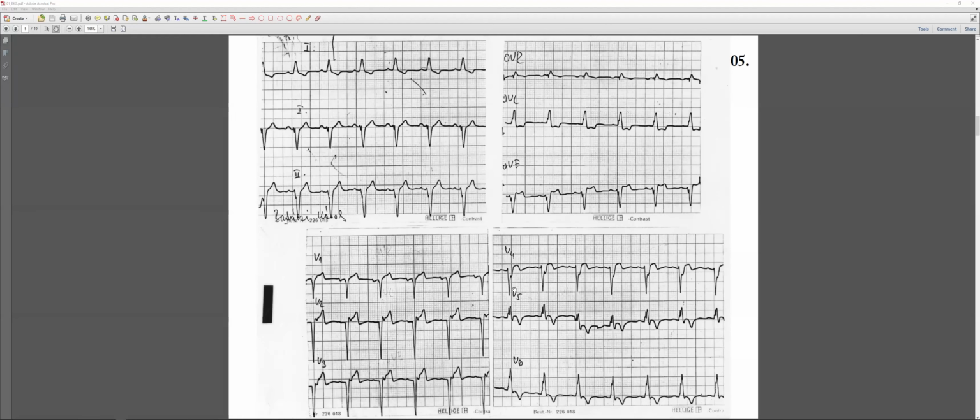The W sign. I don't know what you mean, the W sign. What do you mean, a notching sign? Yeah, the notching sign. It could mean nothing, or because it's wide, it could mean something. Because we do have a supraventricular rhythm, and this supraventricular rhythm somehow is not conducted properly intraventricularly, this is why you're assuming that you do have an intraventricular conduction abnormality.